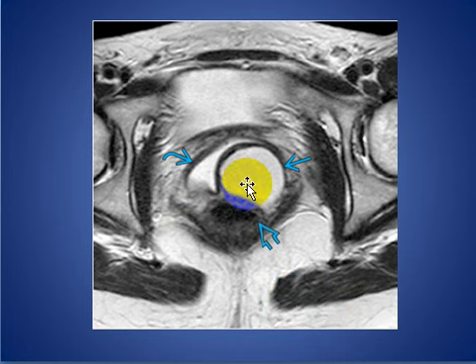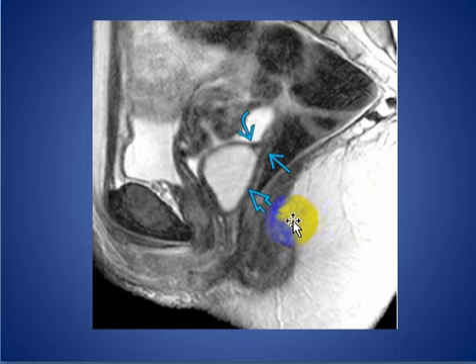Here we see endometrioma of retrovaginal septum on this axial T2 weighted image between the rectum and the vagina, filled with gel. The lesion is homogeneous, high signal intensity on T2 weighted images. And this is the sagittal T2 weighted image of the same patient, which shows that the cyst is here between the rectum and the posterior part of the vagina. The cyst is high signal intensity in T2, between the anterior wall of the rectum and the posterior wall of the vagina.